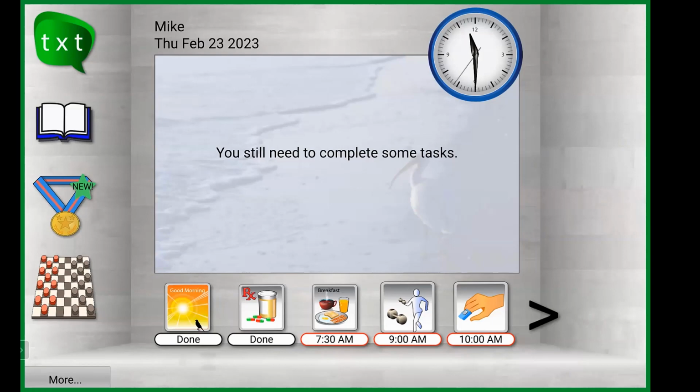So I won't go through every icon here at the bottom because I could go on for minutes, but I hope you get a sense of how you engage and interact with a device like Ibis. And I want to reinforce that all of this health information here is being received by a virtual care team that Ibis Health Services staffs.